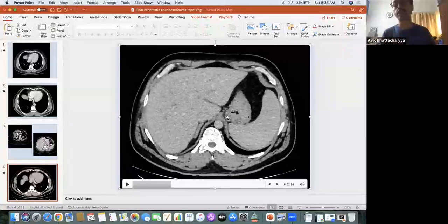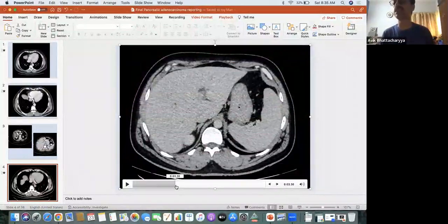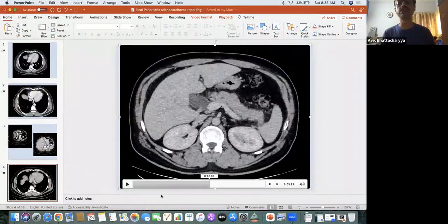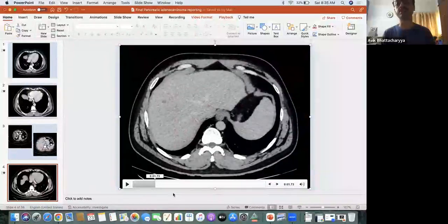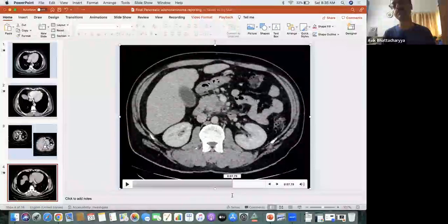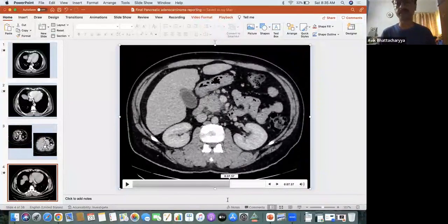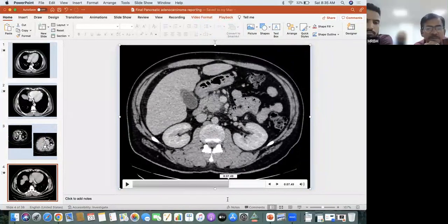And if these liver lesions are metastasis, then there is no point discussing the resectability. It is already irresectable. But if those lesions are cholangitic abscesses, and there is only an abutment of a small segment of superior mesenteric vein, but superior mesenteric artery is free, we can attempt for a Whipple surgery. Is that clear? Yes.